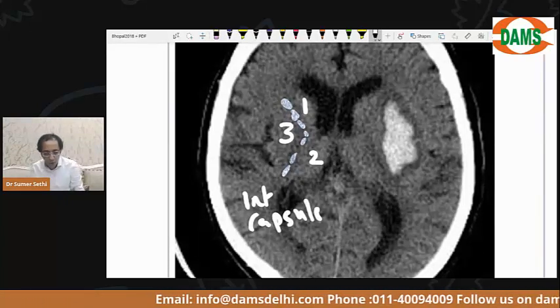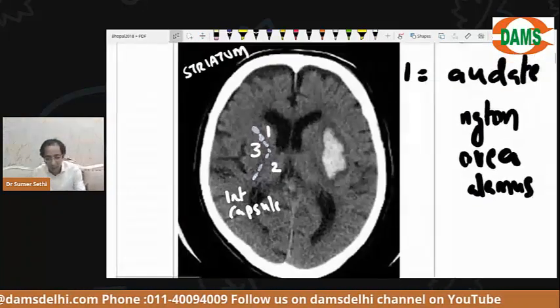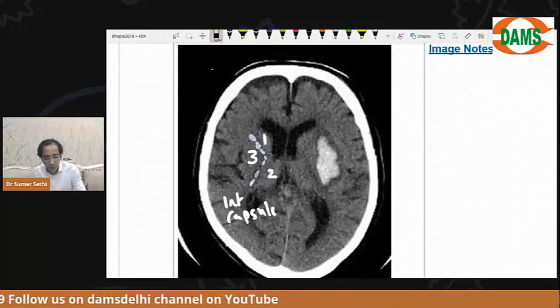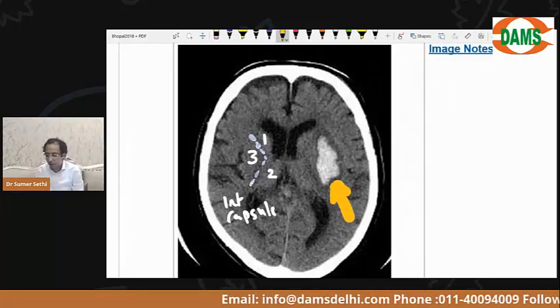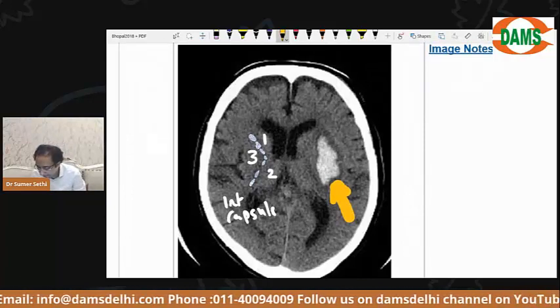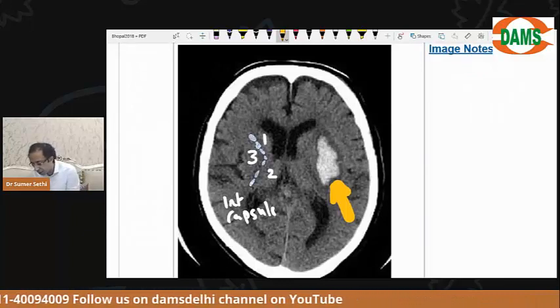Now I want to come to a question that a lot of students were asking. बच्चे सोच के बताना है ना? A lot of students were asking, what do you think is this? ये white सा क्या दिख रहा है? This is not normal. I can see there is a lot of asymmetry. What could this be? हाँ, globus pallidus and putamen together is called as lentiform nucleus.